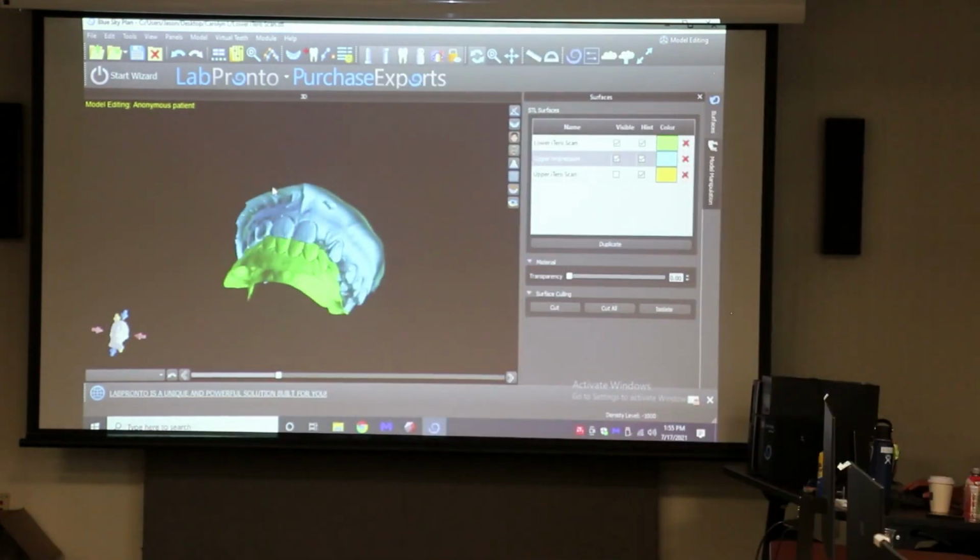Now, as I mentioned earlier, sometimes if you want to be lazy, use the itero and get as much as you can, build it as high as you can, and then reline it. But I typically like to go with this method.